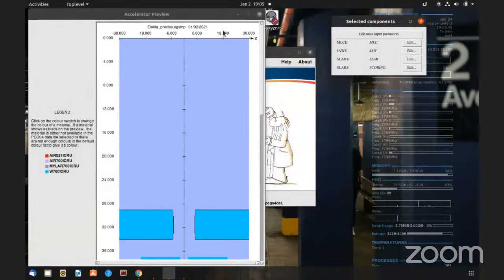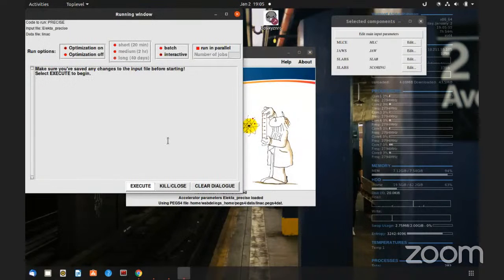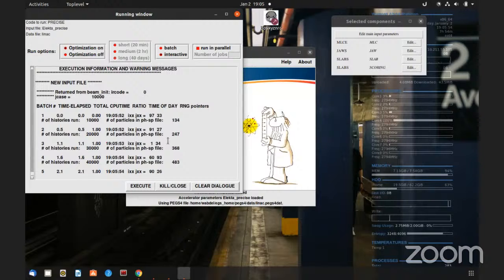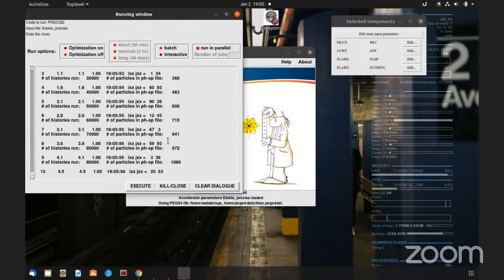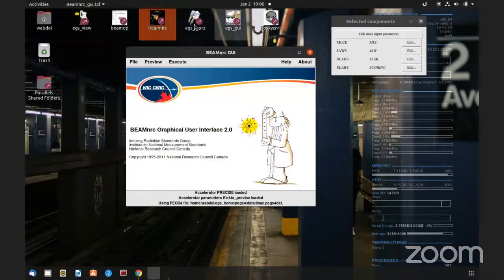So let's run it. Okay, let's execute. And let's use the beam DP.